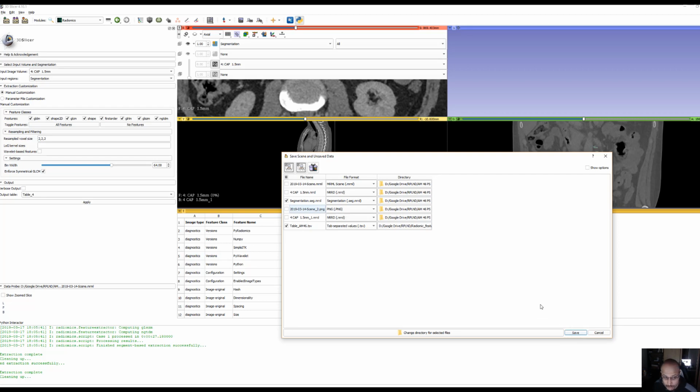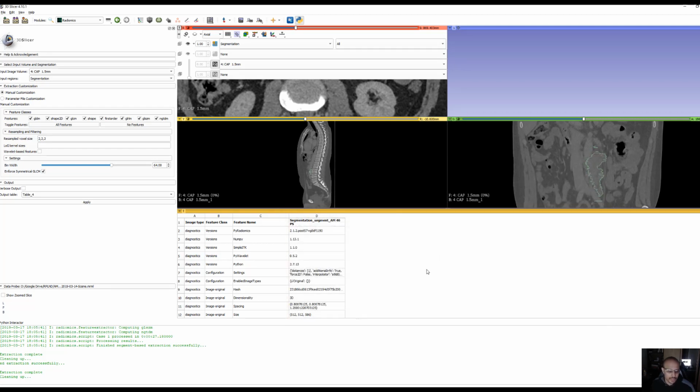So you won't have to work on this one, but you need to go back to the other segmentations and make sure they're clean like I showed you. And then that is your responsibility. I can't check all of them. It's going to be too time consuming for me. Okay, so yes. Right. Now let's see how it looks.